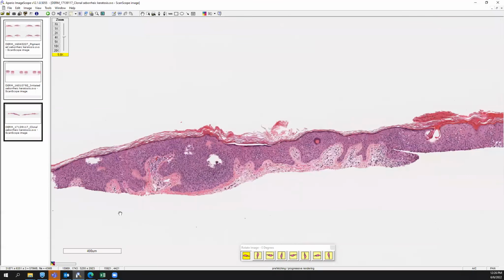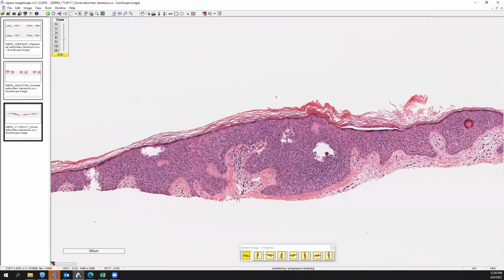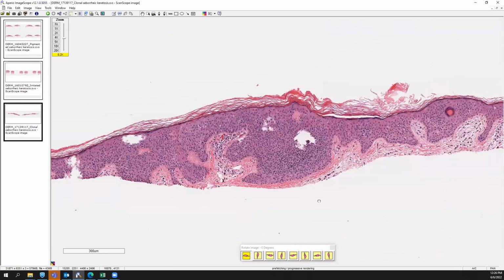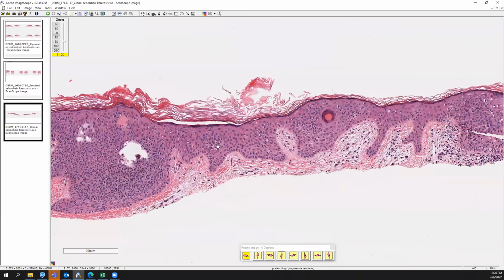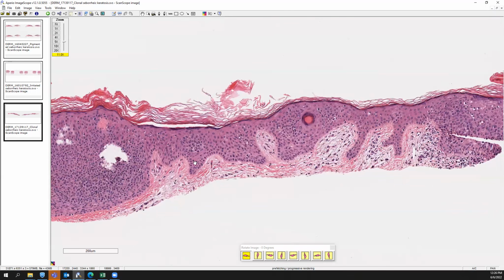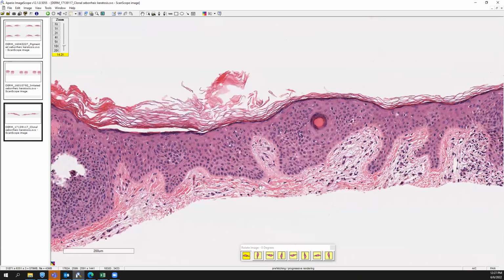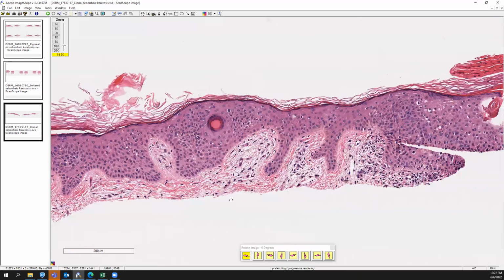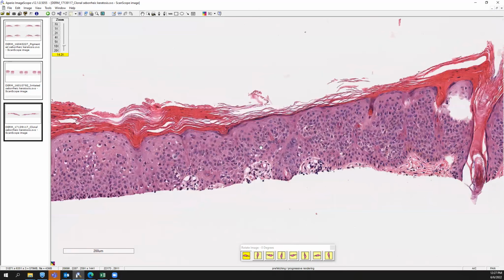Lastly, I'll mention another type of tricky seborrheic keratosis. This one, you can see that it's acanthotic epidermis, and as you scroll from side to side, you'll notice that there are these little nests forming. To beginners, this could actually look like a melanocytic nest, but even to well-trained eyes, some of the cytoplasm here is pretty gray. It looks like it could be a melanocyte population. As you scroll across more, you'll notice that nesting phenomenon.